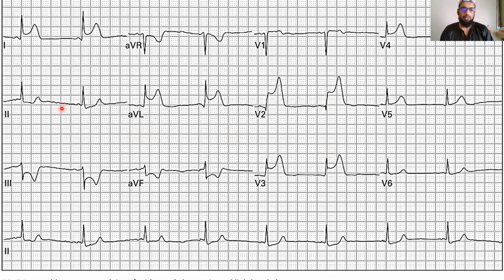Just to get back, the reason why we have the ST depressions, these are reciprocal changes. So I'll explain reciprocal changes again. Let's take for this example, I am lead 3, and you as the viewer are V2. All right. So when this ischemic pattern takes place in the heart, the ischemia damages that part of the cell membrane so that the cell membrane is unable to cause its normal repolarization and depolarization.